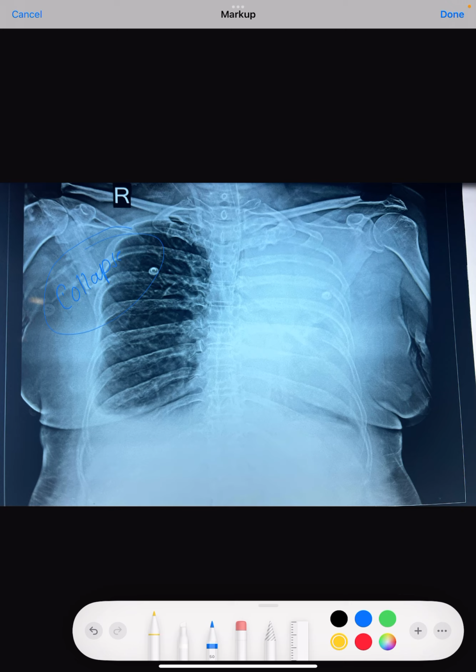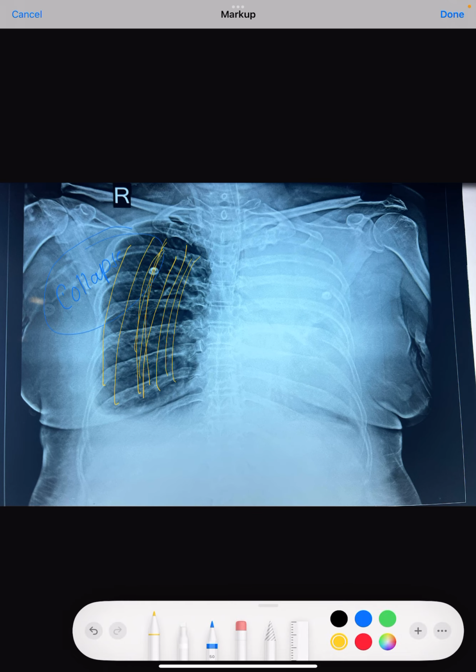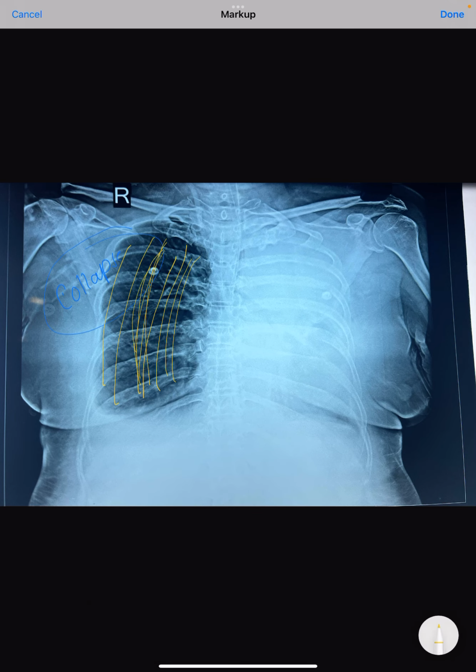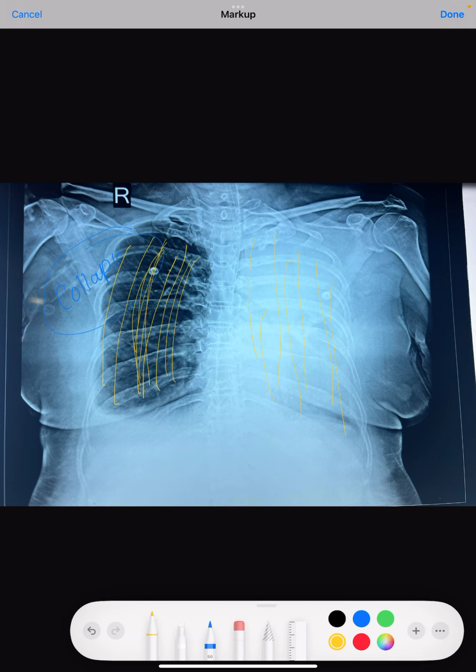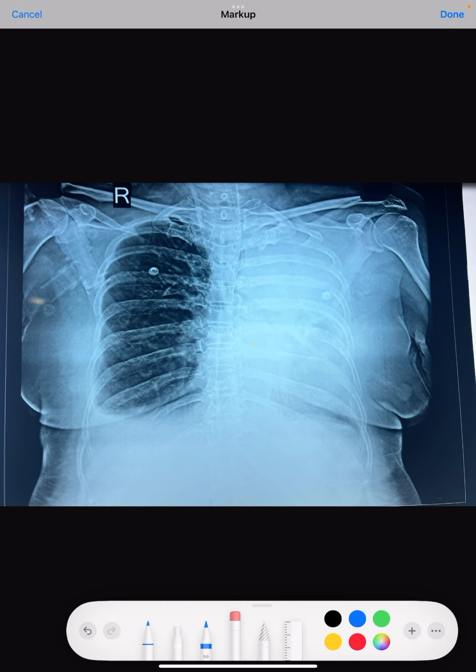The first, second, third X-ray may show this type of lung which is well aerated, well radiolucent. But if some patient has this type of lung and suddenly it goes completely white like this, it means that the patient has developed collapse, because in a few minutes or few hours, the patient won't develop this much pleural effusion suddenly.